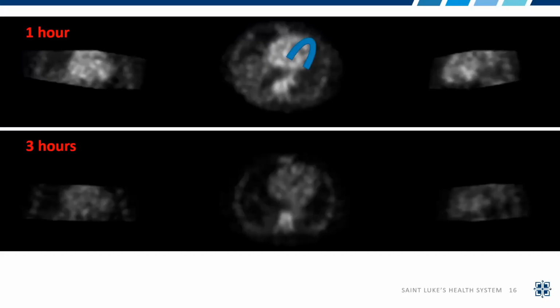Eric, thoughts on this? I know we just touched on this on the prior one, but blood pool changes from 1 hour to 3 hour. We still see blood pool on the 3 hour, but again, it's probably not really blood pool that is high, but rather it's that the bone uptake and the rib uptake is just not as high yet. So you're having this scaling situation.